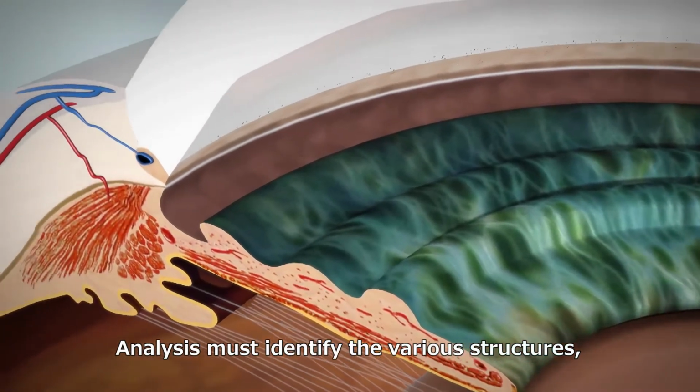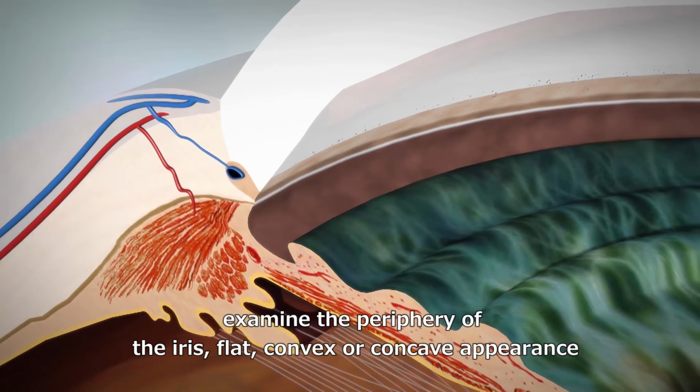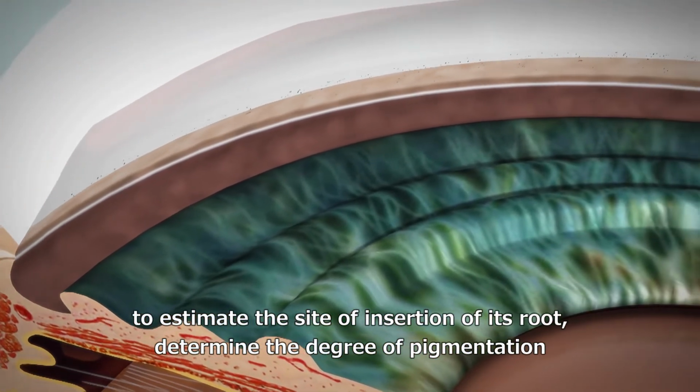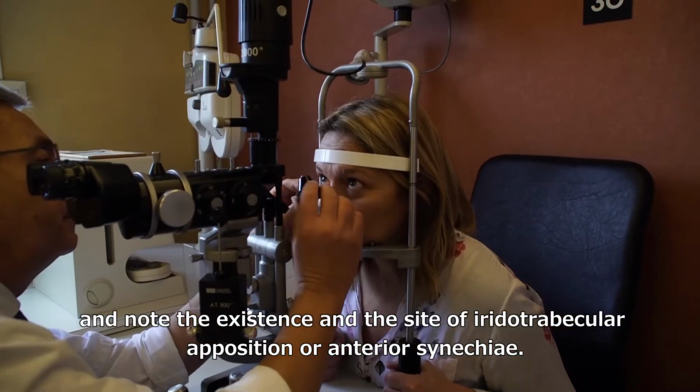Analysis must identify the various structures, determine its degree of opening, examine the periphery of the iris, flat, convex, or concave in appearance, estimate the site of insertion of its root, determine the degree of pigmentation, and note the existence and the site of iridotrabecular apposition or anterior synechia.